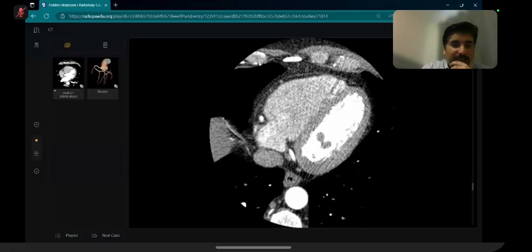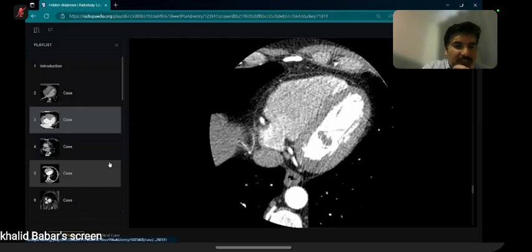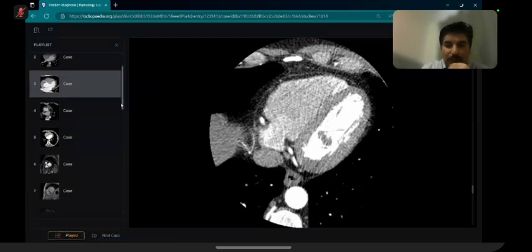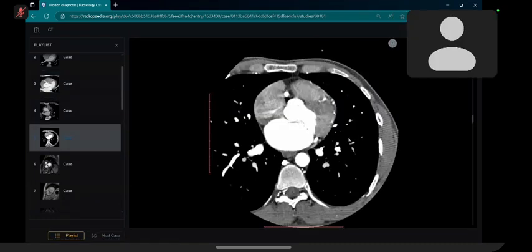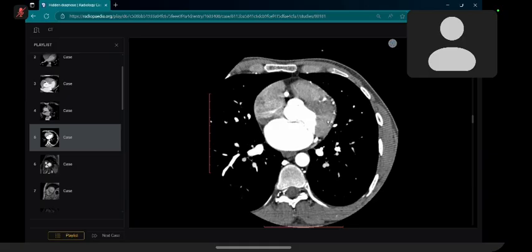Well done, candidates. These were the two cases for coronary anatomies. I think there is one more case for you from my side. Are you there with me, candidate one? Yes, sir, I am here. Can you scroll this case? Sir, I'm requesting the remote control. Yes, please.